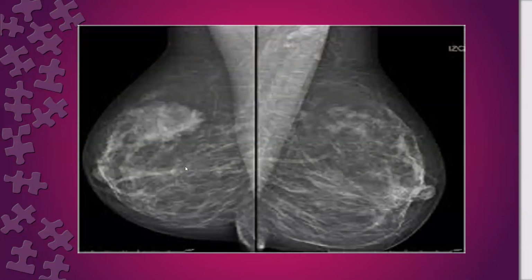For me, the pectoralis major on the right side is smaller, but it is a part of the asymmetry. No, don't say it is a part. It is not only smaller, there is something else apart from smaller. Tell me, is it technical or is it related to that? Because if you look here, you see the apex, the angles, yes, at the same level in the two breasts. But the right one is smaller in size than the left one.